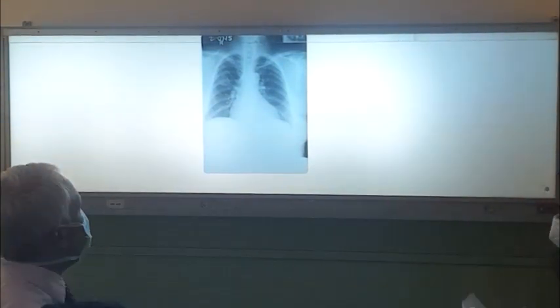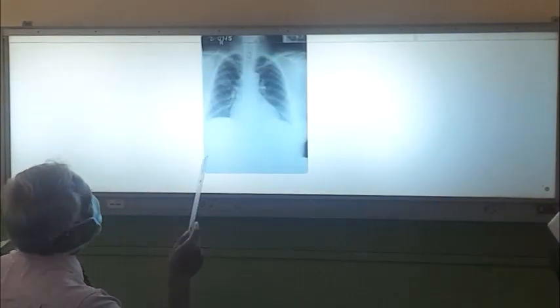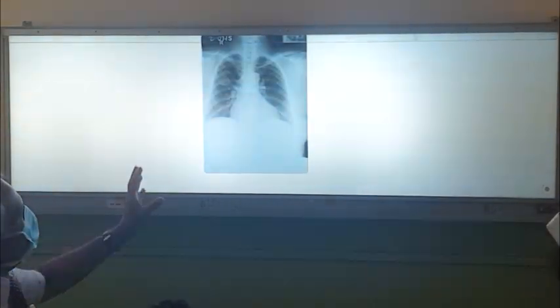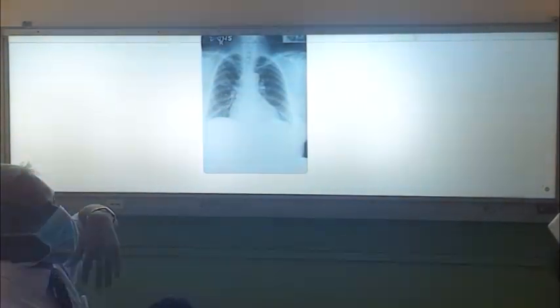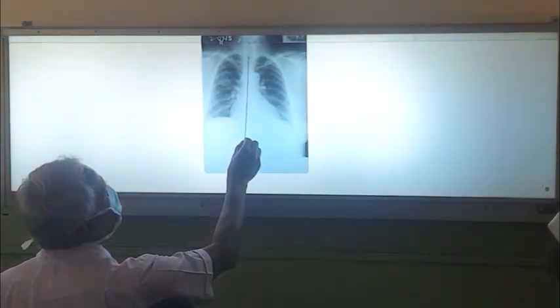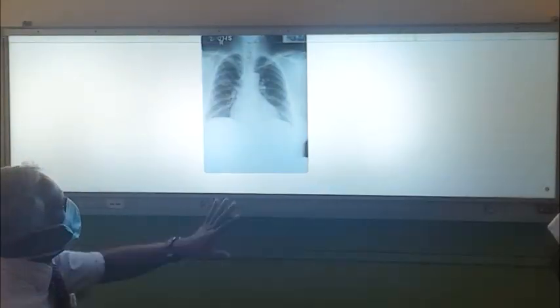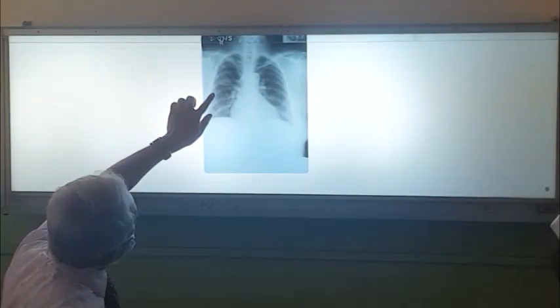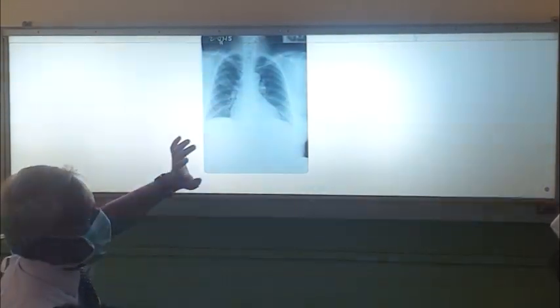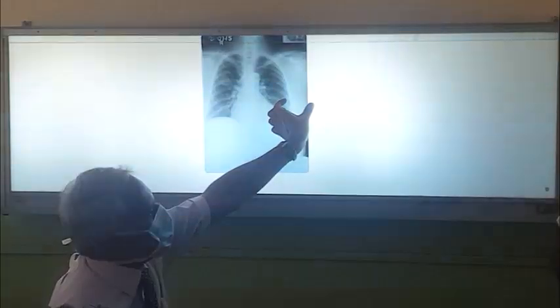This patient came with hemoptysis, and you can see a rounded opacity here, and surrounding that opacity you can see a halo, right? So this is a feature of a cavity with an intracavitary body, right? And now this X-ray is a little bit rotated, you can't see the intervertebral disc here, so this is an underexposed film. So all this whitishness here is due to underexposure, not exposed properly, right? There's nothing wrong here and there, and it's a thick chest wall.